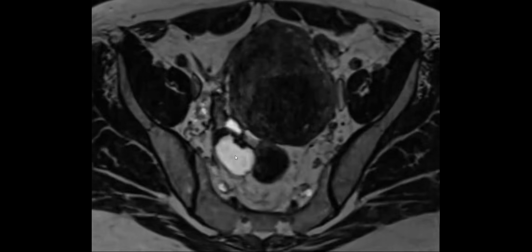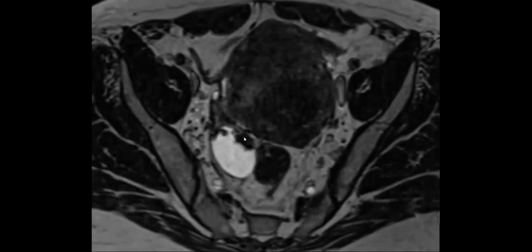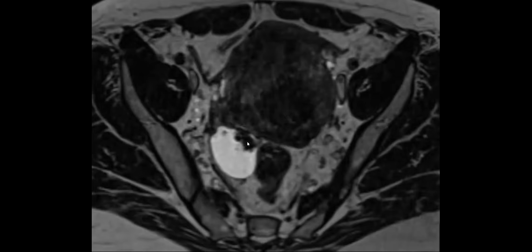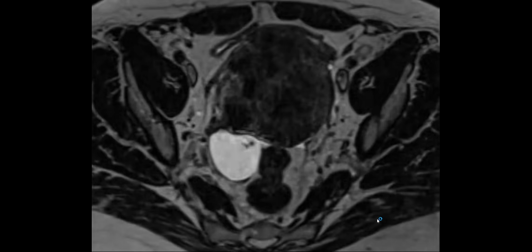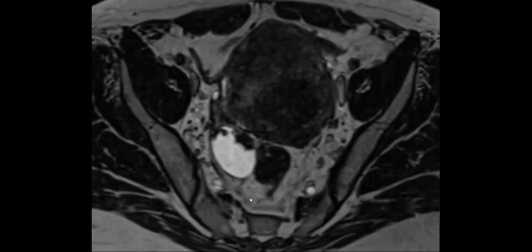I want you to tell us about that, but I do want to point out one thing. Immediately I was like, okay, this could be a cystadenofibroma, but because it wasn't dark on DWI, I had to hedge: I don't know, can't exclude something more. I said benign or malignant, possibly cystadenofibroma, and it was resected, and that's what it was. One interesting thing is that this was 10 years prior.